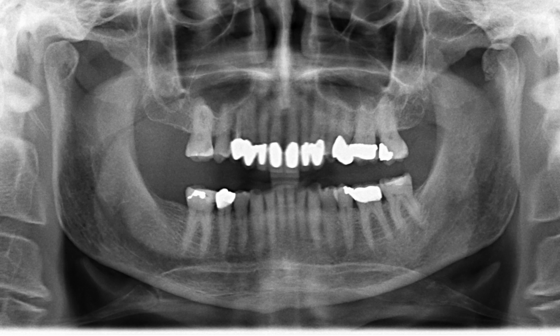So go ahead and compare the right and left condyle and condylar neck, pretty much the entire ramus. Some of the things that you can do are measure, if not look at, the overall length or the height of the ramus. That includes the condyle and condylar neck all the way down to the angle of the mandible.